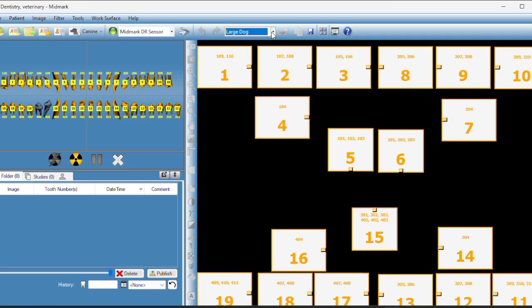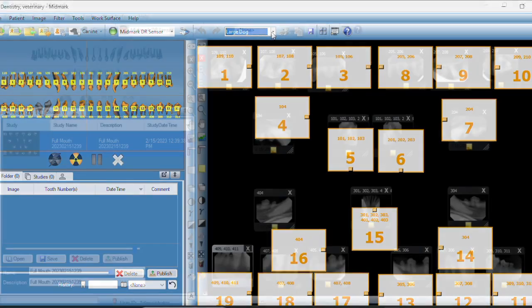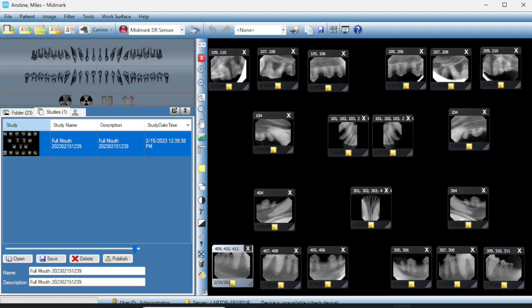So that's just a really nice, easy, pretty foolproof way of putting these together because the software is fairly intuitive and it won't let us put the wrong teeth in the wrong quadrant, so we're confident that our template's going to be correct. And this is what our completed template looks like with all of those boxes populated. Very nice, easy, organized to, again, evaluate and then create your dental chart.